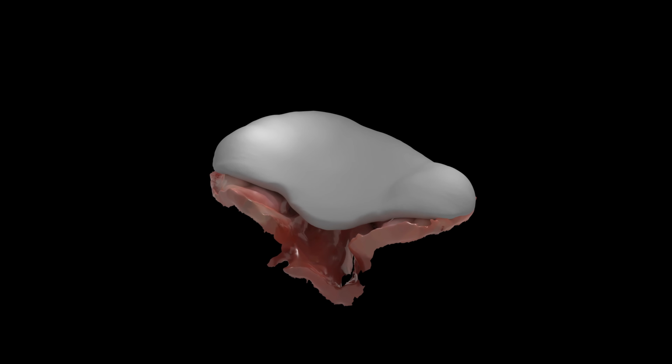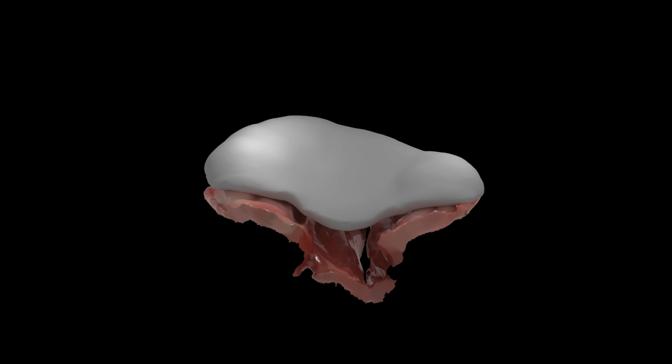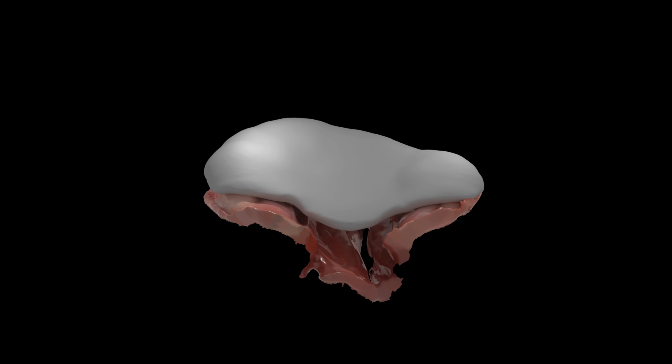Users can optionally adjust the plates through a set of customizable parameters. For example, the plate thickness over different regions, distance of the palatal cleft, addition of artificial rugae as stimulation elements, and a ventilation hole.